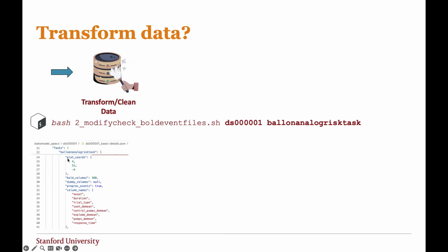And it populates a number of things that you can update, like for the group level, what plotting coordinates to use. It just estimates the first count of bold volumes, not the range of that existing data sets. It has the dummy volumes. So if you have calibration volumes, how many do I need to cut off if I'm needing to update? The default is null.